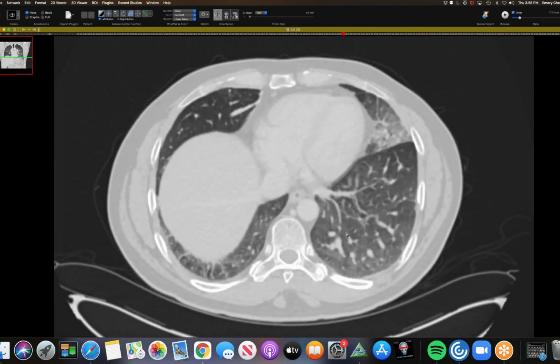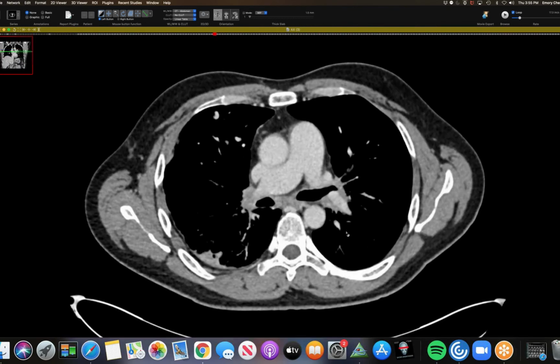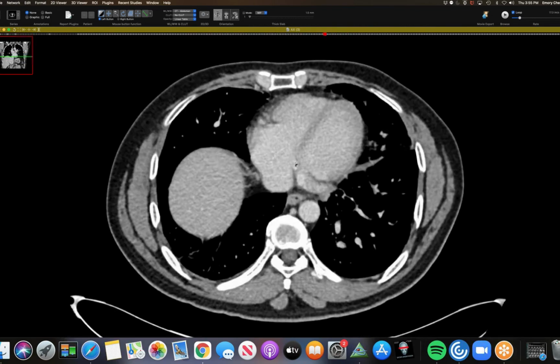Yeah. Is that the pulmonary artery? It looks to me as if you might have. The pulmonary arteries didn't really strike me as dilated, but it is dilated here a little bit. And it looks as if there's a little right heart strain too, maybe. Yeah, a little bit.